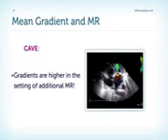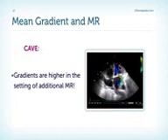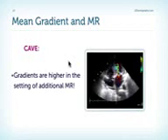Another reason for elevated gradients is patients also have mitral regurgitation. Now, this is a fairly frequent finding in the setting of mitral stenosis, as you can see here in this example, a patient who has mitral stenosis and additional MR. And since we have pendulous flow, in other words, volume load across the mitral valve, the gradients are also higher.